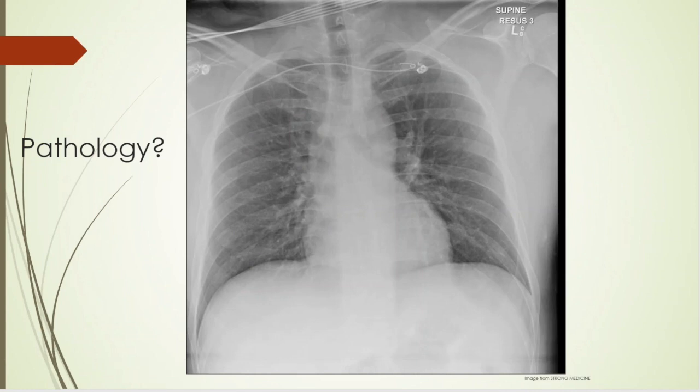And another film here. This is an interesting one. Let's start off. So again, the clinical picture really helps. If you just get a chest x-ray and you have to pick this stuff out, it does make it more difficult. So if you do have the clinical picture, it's easier. We'll just say this patient was short of breath and came in to the emergency room.